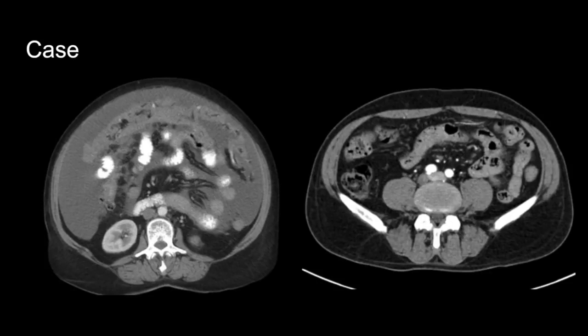There are peritoneal metastases from a primary malignancy that are spreading through the peritoneum. When you have omental caking and peritoneal metastases in a female, the most common cause is ovarian cancer. Other things that can cause this appearance include other GI cancers, things like colon cancer, pancreatic cancer, gallbladder cancer, etc.